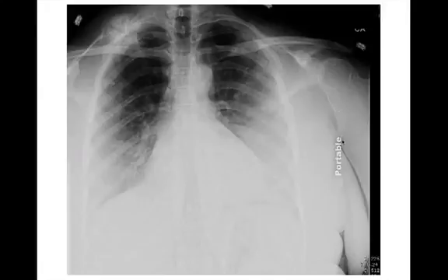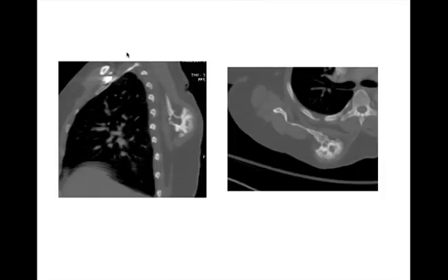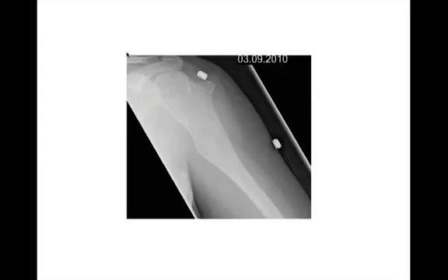This was another osteochondroma. This is a sessile osteochondroma of the proximal humerus. So if you saw this, because this is clearly an osteochondroma, you should be able to look at this and say this is probably part of an osteochondroma as well too. So multiple osteochondromas again. Here's just another view of the humerus. So not only did they have one here, they also had one coming off on the lateral aspect of the proximal humerus.